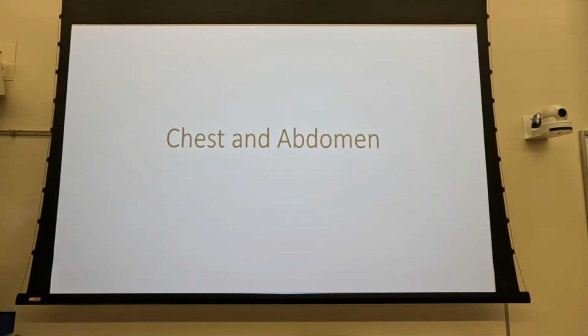It's been a minute. And they weren't real good about following the JCERT rules at the time. So me and another early first semester student went in and did a PA and lateral chest X-ray. Lateral came out, like, something's not right with that image.